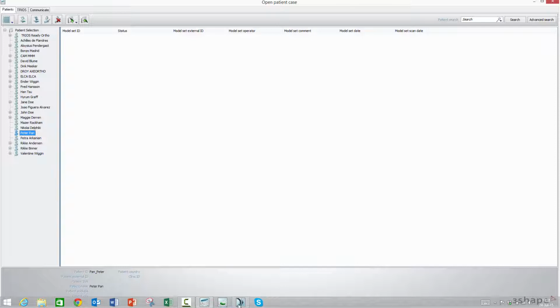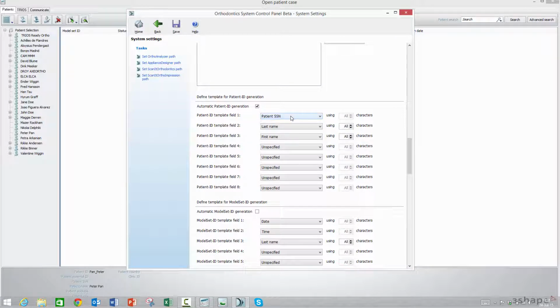So normally I recommend that it's up to you, of course, that if you do date, because date will always be there, that's the date when you create it.